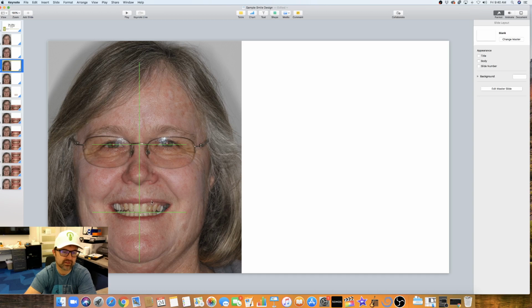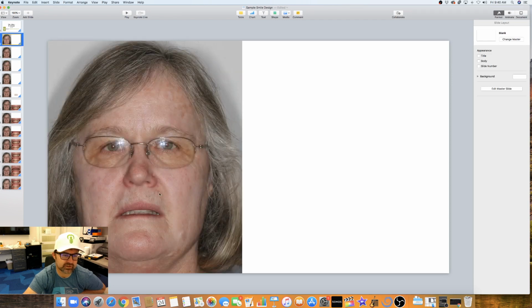The teeth, you can see in relationship to the lip, again, you see more gingiva on the left side than you do on the right side. We'll get a closer view of this in just a minute. Her eyes, which I pointed out in the first videos, I think they're not perfectly symmetric, horizontal with one another or parallel to one another. So all those things are important. If you come back here on this one, it looks like she has decent facial proportions. You can talk to her about how her lip droops a little more on the right side, how her incisal edge position presents. Which are all important things to look at and analyze.